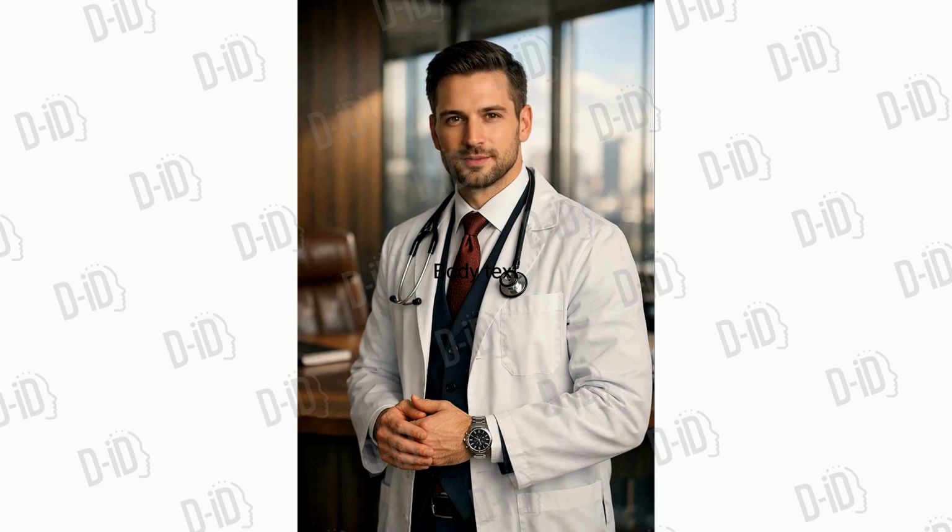Welcome. In this video, we'll learn how to differentiate retinal detachment from choroidal detachment using radiological imaging. First, a quick anatomy review. The retina is the inner neurosensory layer, firmly attached at the optic disc and ora serrata. The choroid lies external to the retina, separated by the potential suprachoroidal space.